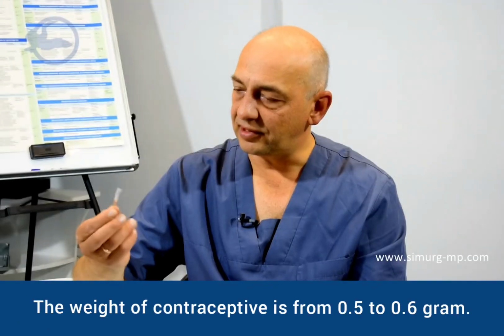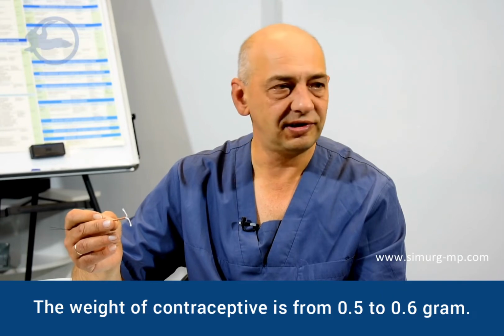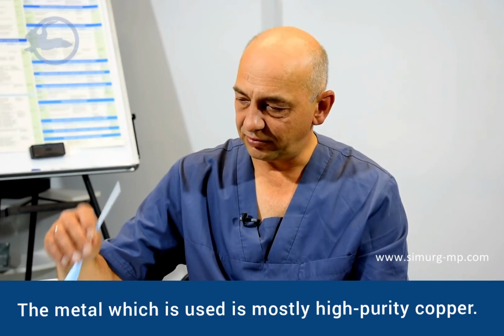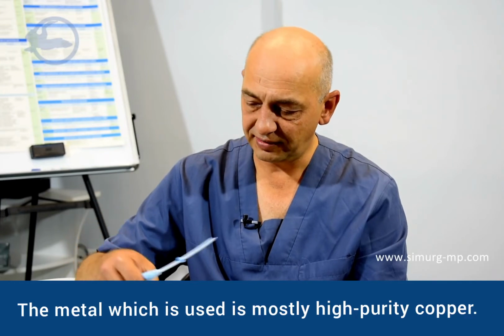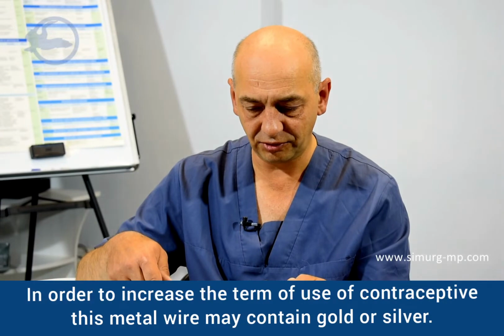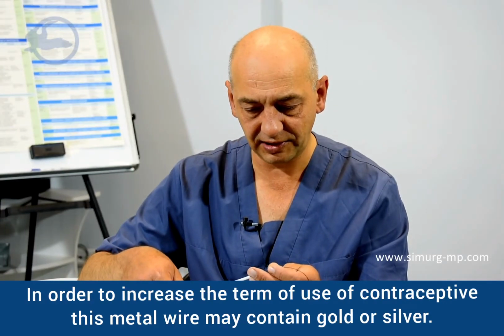The weight of contraceptives is from 0.5 to 0.6 grams. The metal which is used is mostly high-purity copper. In order to increase the term of use of contraceptive, this metal wire may also contain gold or silver.